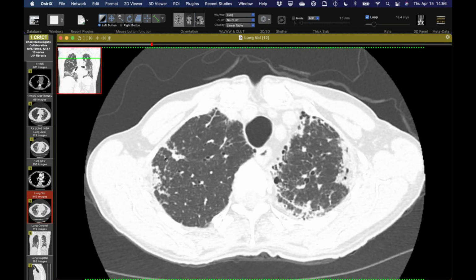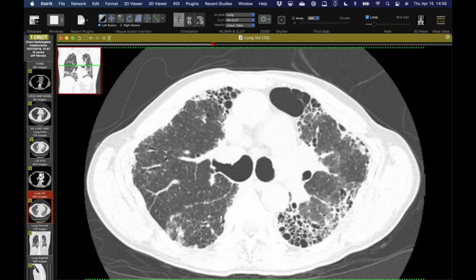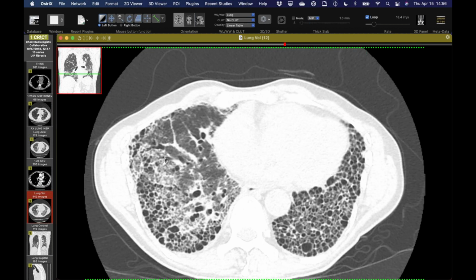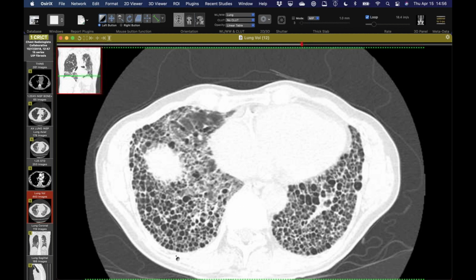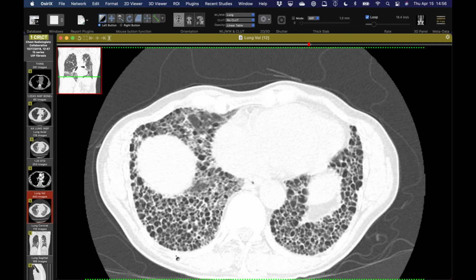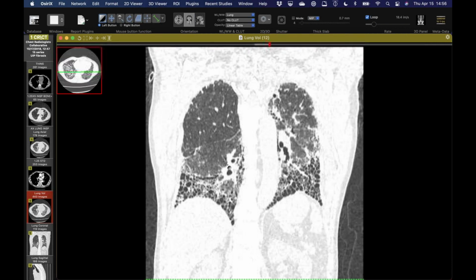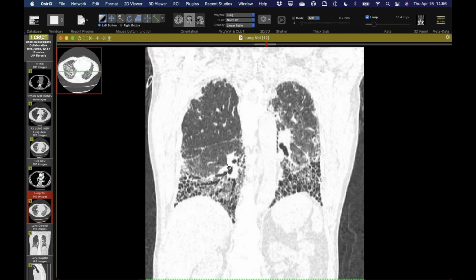It's almost just a rapid increase. And you can see we've lost a lot of volume in the lower lobes, and it goes all the way down. So it technically meets criteria for UIP, but it has a couple of funny features. There's that so-called exuberant honeycombing, or at least in its early phase. I think there's also a nice relative straight line or horizontal line interface that Jonathan Chung and colleagues in Chicago described, where on the coronal you see this abrupt transition.